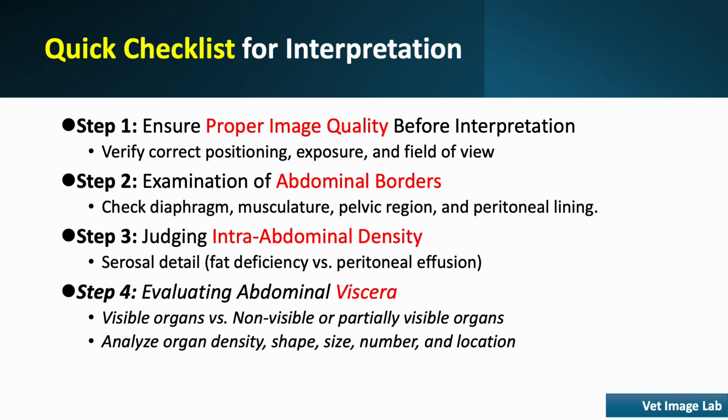After that, analyze the abdominal viscera. Compare visible and non-visible organs, and systematically evaluate each structure for changes in density, shape, size, number, and location.